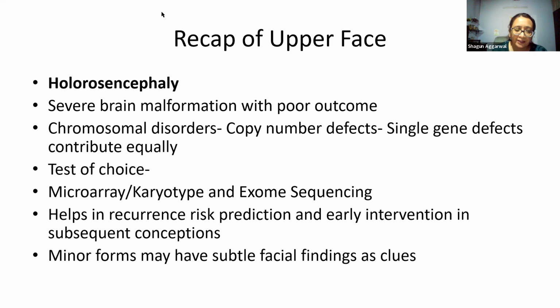One more important thing, because this was a webinar on the face: sometimes the face can have some very minor subtle findings, which if you see, then you should take a closer look at the brain and start thinking that this could be some kind of a milder form of holoprosencephaly.